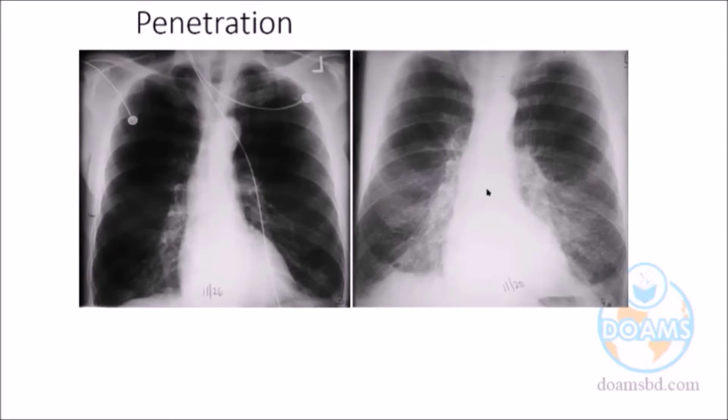So what is the difference in the outcome? You see that there are some bihilar shadows, increased vascularity, and bronchovascular markings are more visible. Again, this is due to technical error. The X-rays are not penetrating enough, which is the standard. So this is one reason for wrong information. Again, the technical problem is penetration.